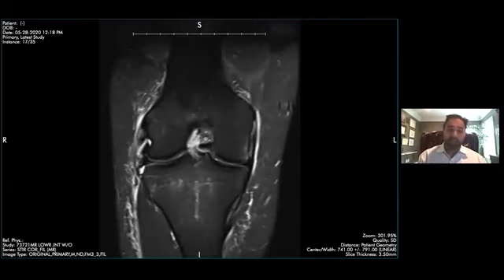So you can see the nice microtrabecular contusion here along the lateral femoral condyle. Okay, you want to make sure there's no chondral defects, right? So this is the marrow. This hypointense dark line is the cortex, and this gray intermediate signal is the articular cartilage, right? So you want to scrutinize this cartilage well.